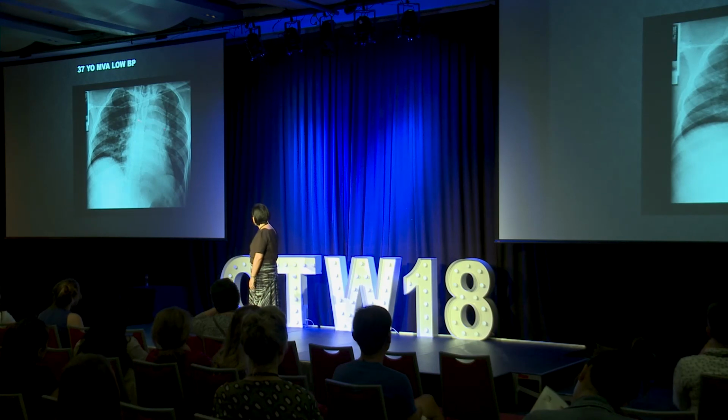So I'll be concerned that there will be a vascular injury. On a supine film or an AP film, obviously the mediastinum always looks bigger. So I tend to ask the referring doctor, look, was that a high-speed MVA? This kind of look could be normal, especially if you've got a previous chest X-ray to compare. If previously the mediastinum always looked a bit big because they've got an aortic aneurysm, then you just go, okay, this hasn't really changed over the last couple of years or over 10 years. But if it's the first time, he's 37, so he's probably unlikely to have had a chest X-ray in hospital or anywhere. You have to raise that possibility.